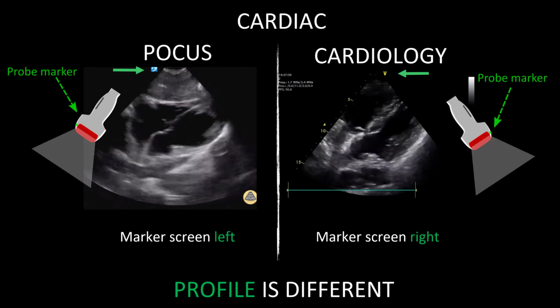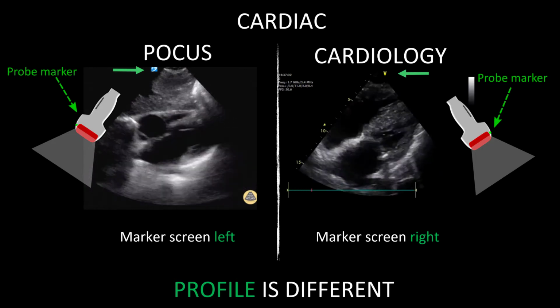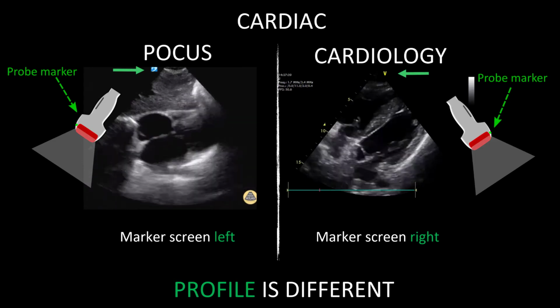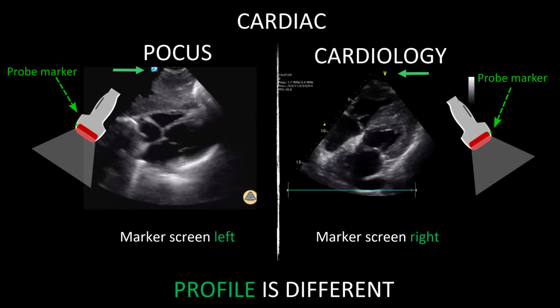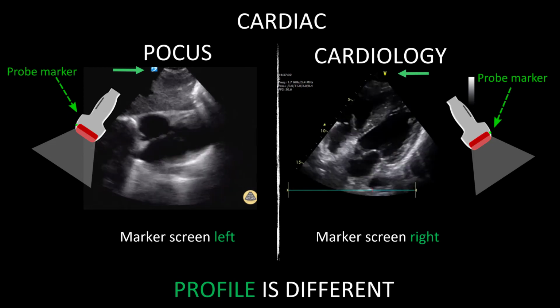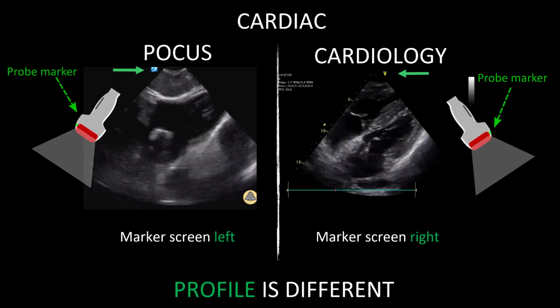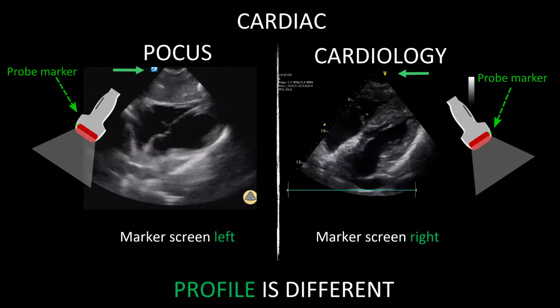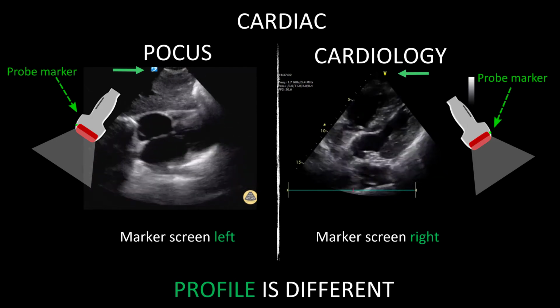Cardiac evaluation utilizes multiple standardized views, as do all ultrasonic applications. However, compared to other applications, we usually work along a single cut plane. Cardiac ultrasound rotates in multiple planes. To add insult to injury, the cardiac convention has the orientation marker on the right of the screen, and the LV apex is on the right of the screen in the apical 4-chamber view.